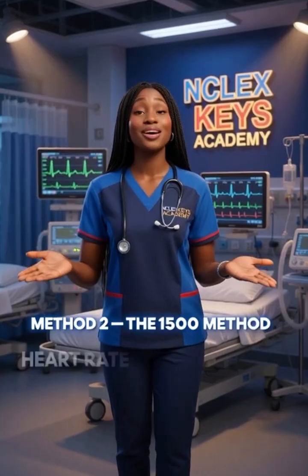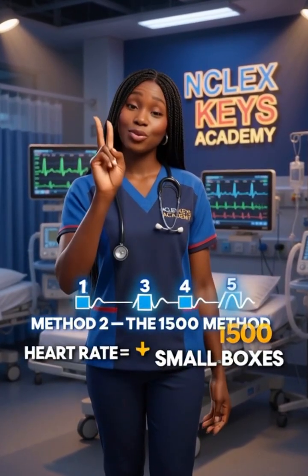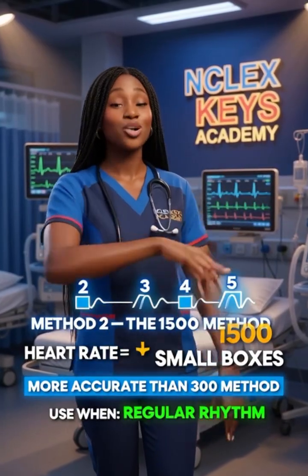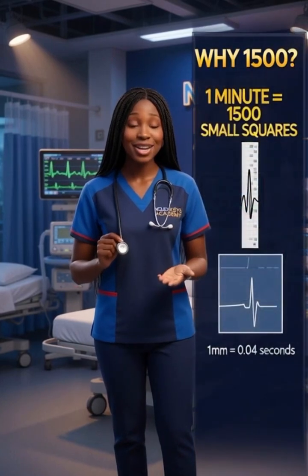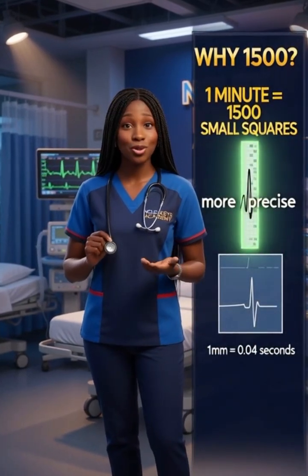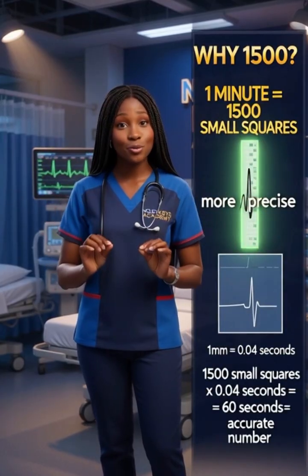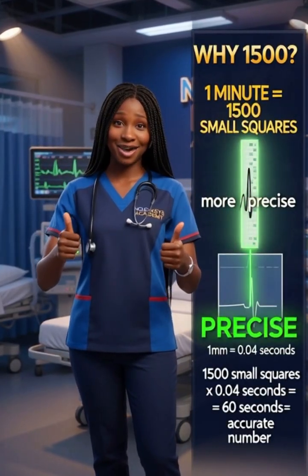Method 2, the 1500 method, also called the small box method. This method is more accurate and also used for regular rhythms. Count the small squares between 2 R waves and divide 1500 by that number. Why 1500? Because there are 1500 small squares in 1 full minute on ECG paper. This method is more precise, especially when the heart rate is fast or when you need an accurate number.